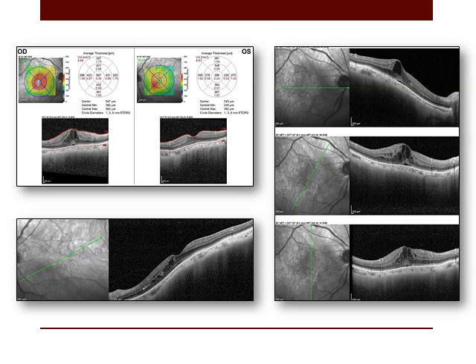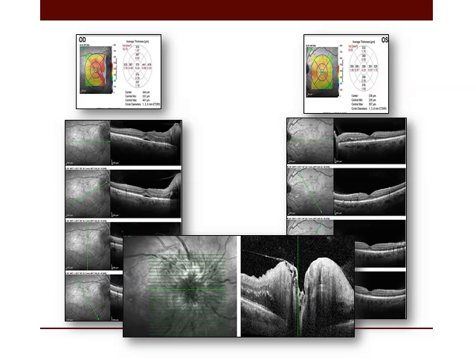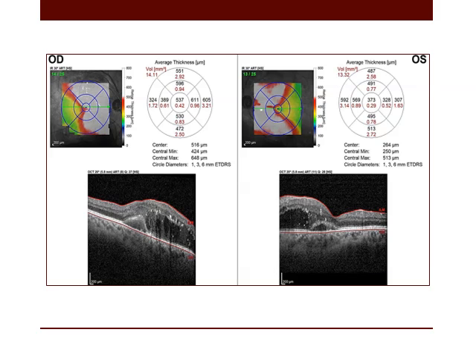Also, any patient with hypopigmented fundus or myopic fundus, it is very important to examine him with OCT, not fluorescein, because the fluorescein cannot detect leakage with hypopigmented or myopic fundi. If the leakage or the thickening is towards the disc more than central macula or temporal macula, search for a reason at the disc. The diabetic patients are very susceptible to diabetic papillopathy occurrence, as in this patient. The presence of malignant hypertension due to renal insult inducing thickening around and in the disc rather than diabetic changes.